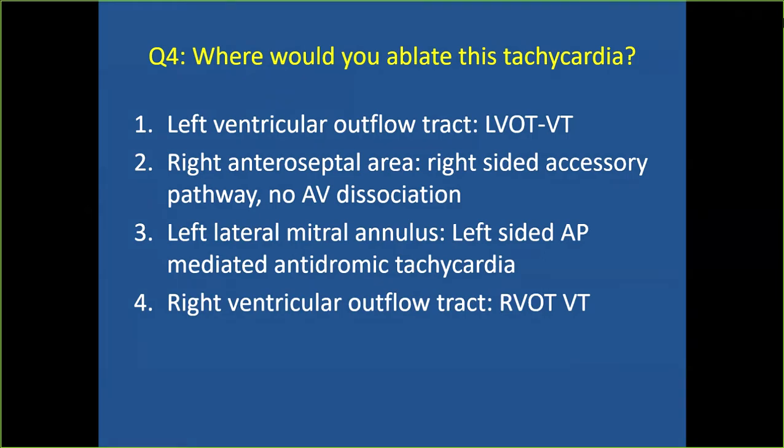So the majority went with RVOT, right ventricular outflow. That's fantastic. If it is a left-sided tachycardia, we would have a right bundle branch block, right?